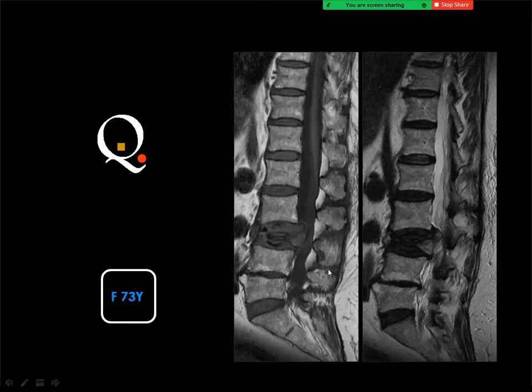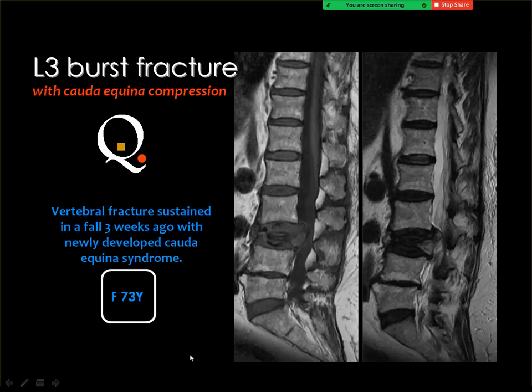You should know that these osteoporotic fractures are sometimes associated with bone marrow edema, especially if the fracture is recent. This would not be mistaken for a neoplastic pathology like metastasis, because of the residual bone marrow which can be identified in the body of the vertebra. Also, you can appreciate absence of paravertebral soft tissue components. And this is an osteoporotic fracture.